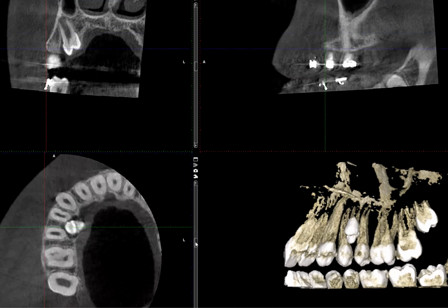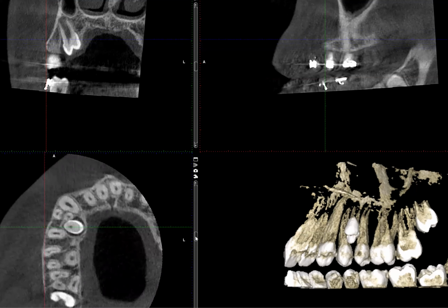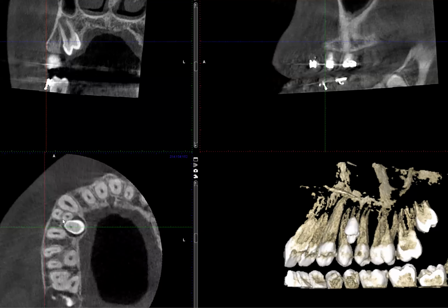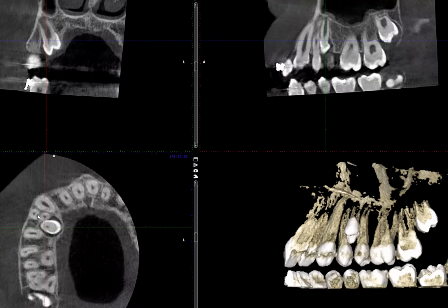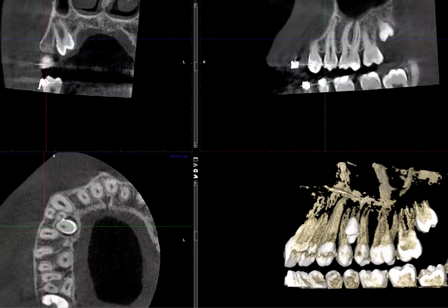One of the things that I like to evaluate when I'm seeing a supernumerary or any of the impaction cases, typically, I want to see if there's an associated root resorption. In this case, I think an argument could be made for either case, whether there's a resorption of this palatal root of number 5 or not. If there is, it's very minimal, but there's no overt amount of resorption. That I think most of us can agree on. Whether there's a resorption or not, that's something we could probably argue, but I at least would say there's no significant resorption.